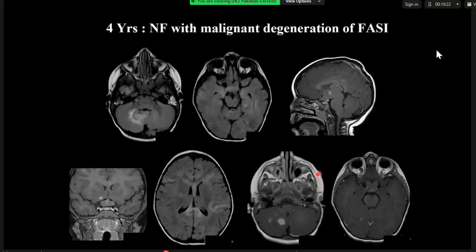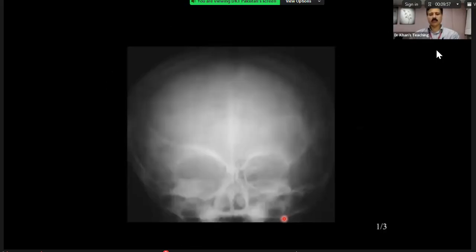So in this patient who is a known case of neurofibromatosis, there is bilateral enlargement of the optic nerves, including the chiasmatic region. This does not show contrast enhancement. However, there's a lesion more posteriorly in the paramidline right cerebellum. That's fine. So this is the type of case you are expecting in the exam, where you then call this malignant transformation.